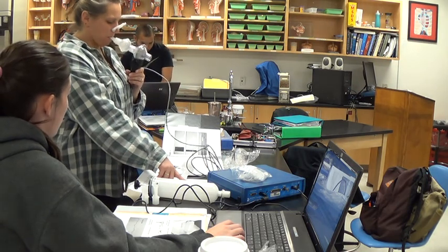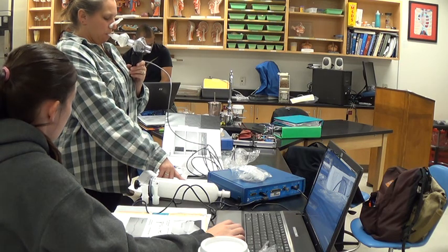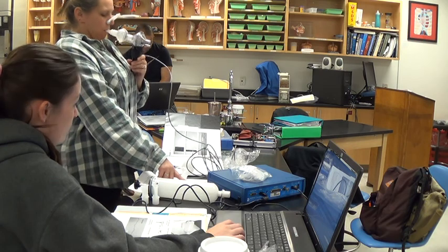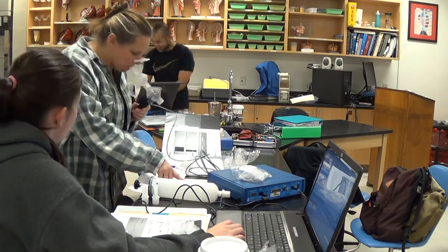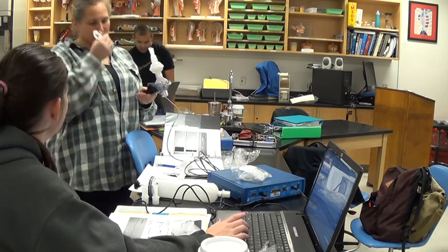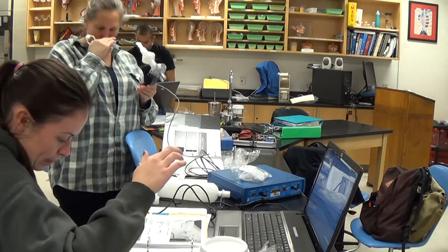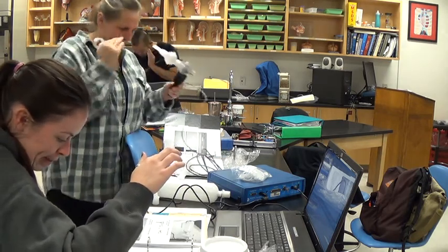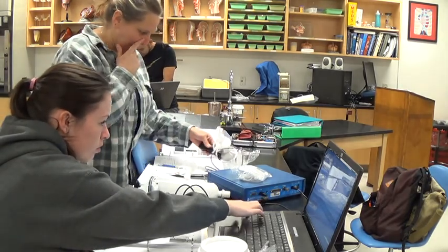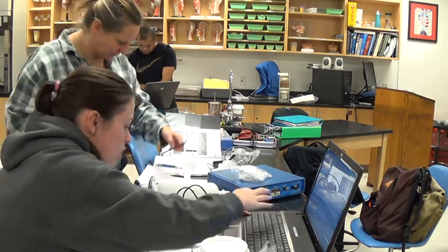Because the PP, you may not be able to go exactly. You might want to take both and the average between them. But that's as close as you can get. Then 981 mils would be your FEV1. And then you're going to measure without paying attention to the time. You're going to measure the whole volume, your vital capacity, from there to the bottom. And that's your FVC. And you divide the FEV by the FVC.